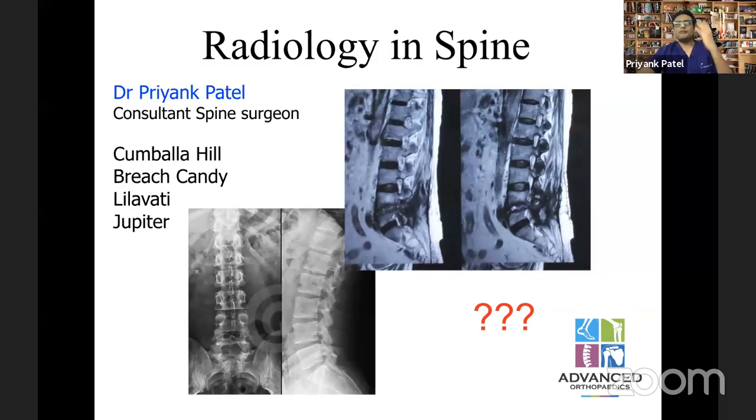Typically you have four films, which are divided into sagittal images and axial images. What you see here is a sagittal image. So pick up the sagittal images and then identify which one is the T1 weighted image and which is the T2 weighted image. See the CSF column: what appears black is T1 and what appears white is T2. So first pick up the T2 weighted sagittal section.